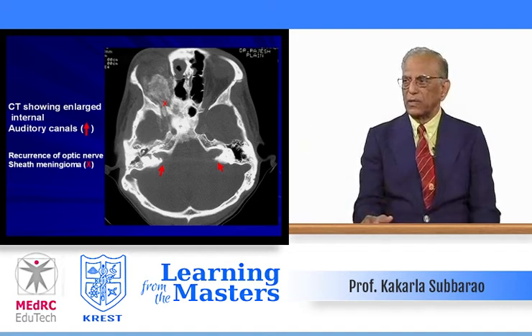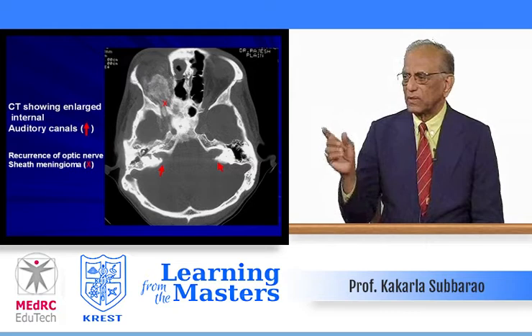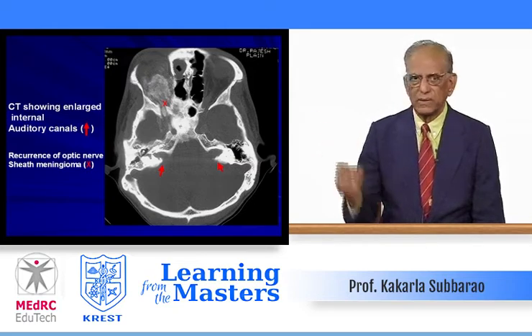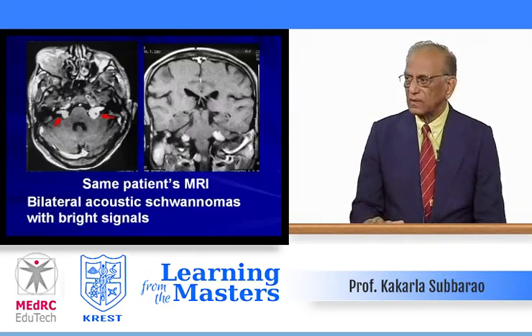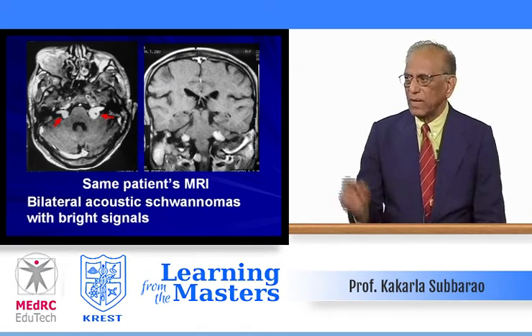Another case, CT showing enlarged internal auditory canals, recurrence of optic nerve sheath meningioma, same patient, recurrence. Same patient's MRI, bilateral acoustic schwannomas with bright signals. Look at the arrows.